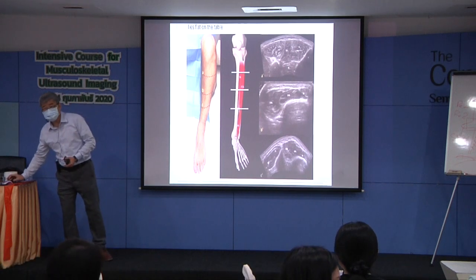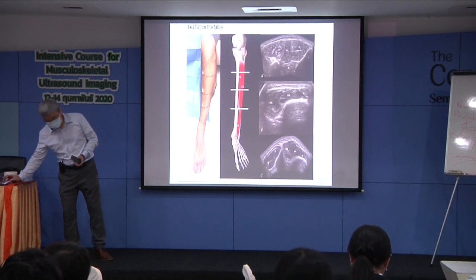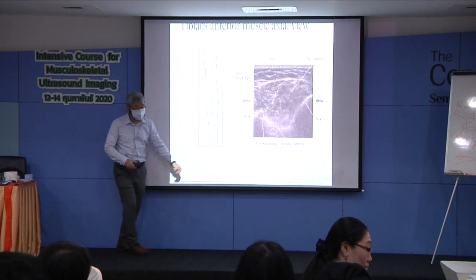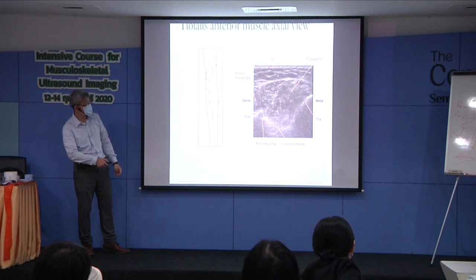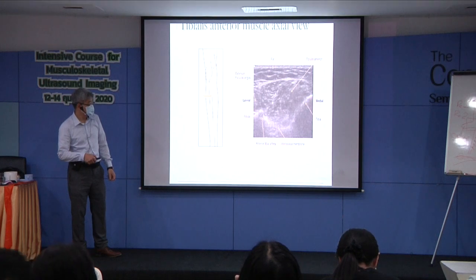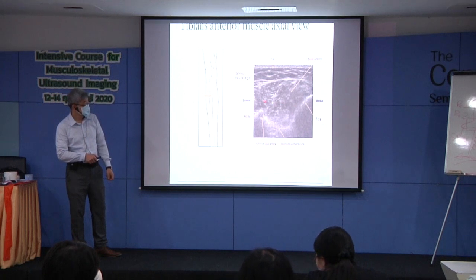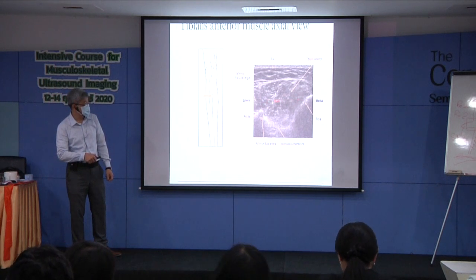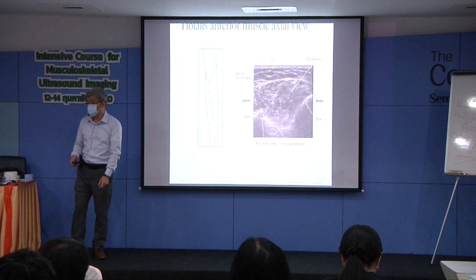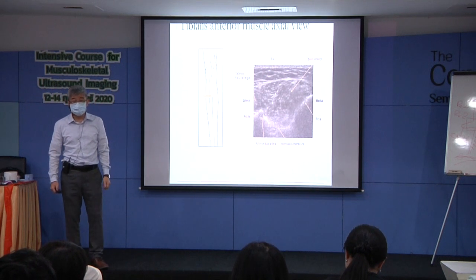Okay, so you need to find a textbook, probably not very good, but one that shows you just one picture, one window, right? So, in this case, this is the tibia. Tibialis anterior. No borders between the superficial part and the middle, no border between the superficial part and deep part. So, it's upper third or middle. Upper third or middle.